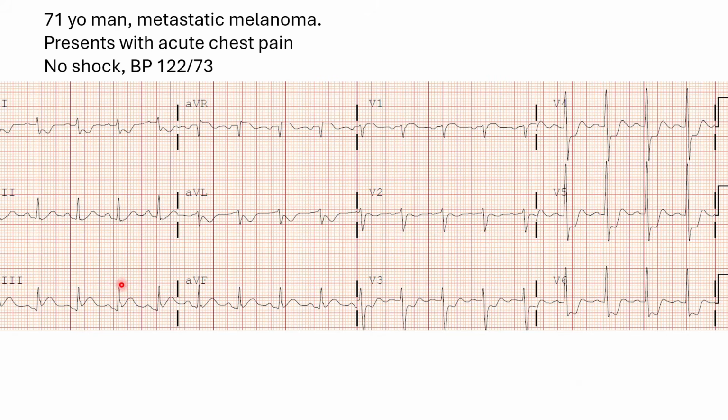So the ischemia is more pronounced in the inferior wall. When the left main gets ischemic, the RCA, which is being fed by collaterals from the left, gets more ischemic than anything else and gets so ischemic that you develop some degree of ST elevation injury in the inferior wall.